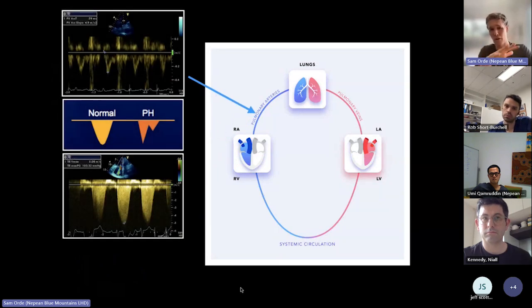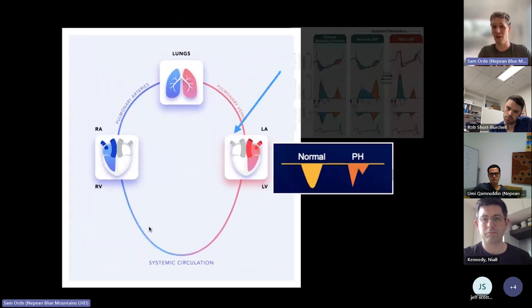And in these right ventricle afterload assessments, one of the things we look at is whether we've got this systolic notching, which is suggestive of pre-capillary pulmonary hypertension. As in, is it all the ARDS or the lung fibrosis or micro thrombi or too much PEEP, or it's all of these things that are sort of happening in this area of the capillaries that are causing that increase of that RV afterload that's putting all the stress on the heart? Or is it something to do with the other side?